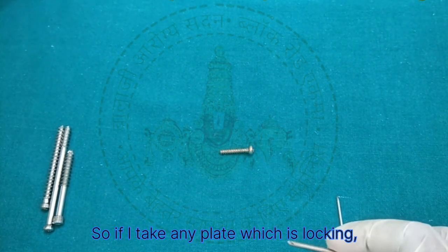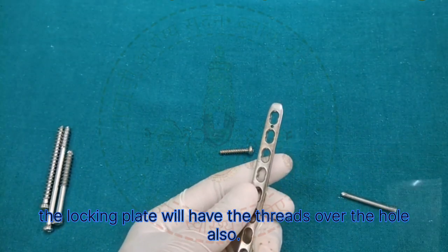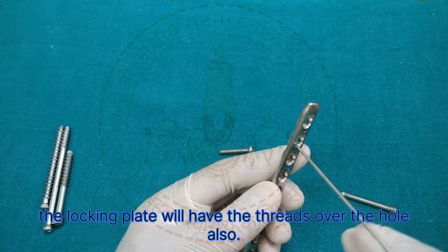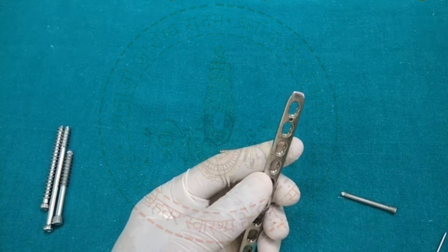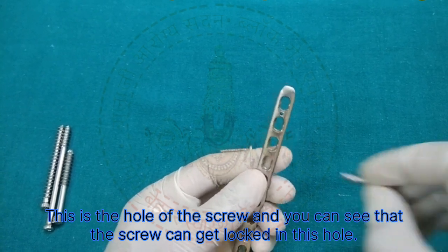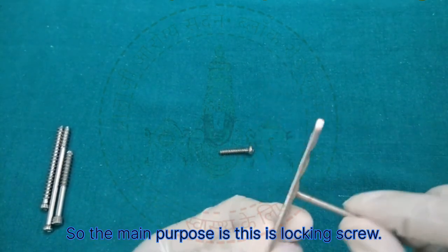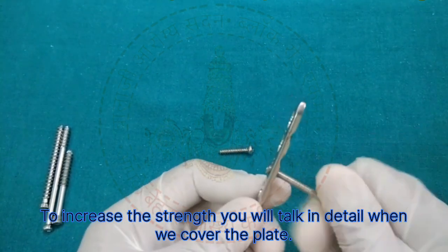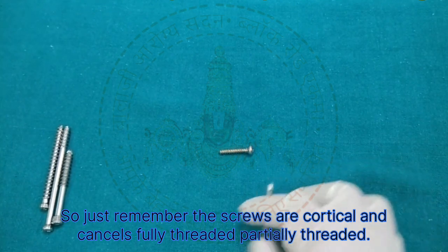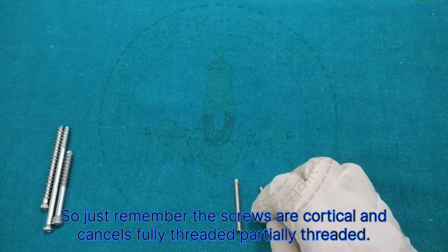So if I take any plate which is locking, the locking plate will have threads over the hole also. Now this is the hole of the screw, and you can see that the screw can get locked in this hole. So the main purpose of the locking screw is to increase the strength. We will talk in detail when we cover the plate. So just remember the screws are cortical and cancellous, fully threaded, partially threaded, locking and the simple one.